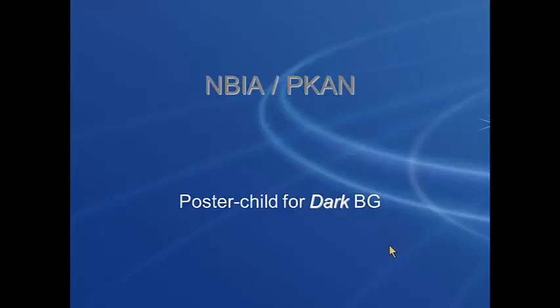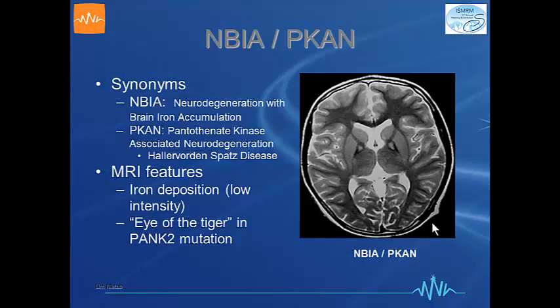Now, the poster child for the dark basal ganglion abnormality basically is this group of patients now called NBIA and PKAN. Used to be called Hallervorden-Spatz disease. Now with better political correctness, we prefer the NBIA diagnosis.